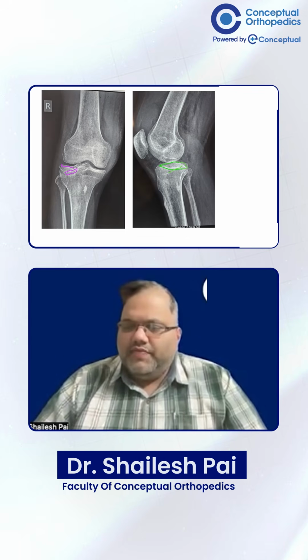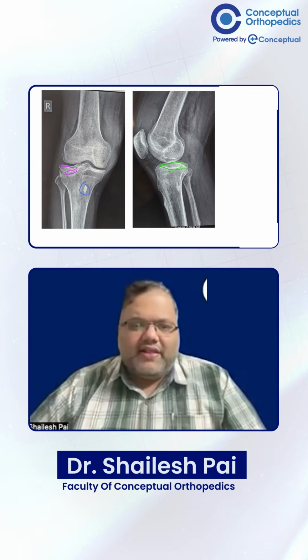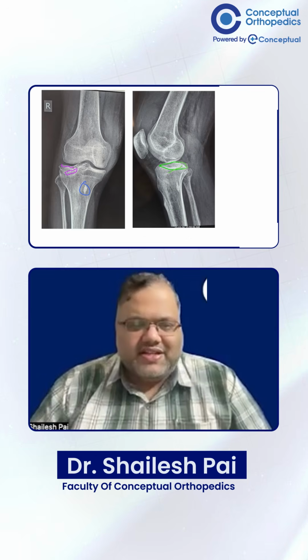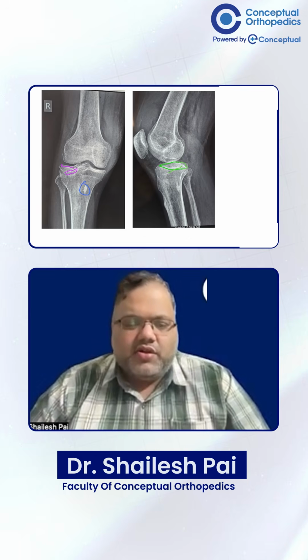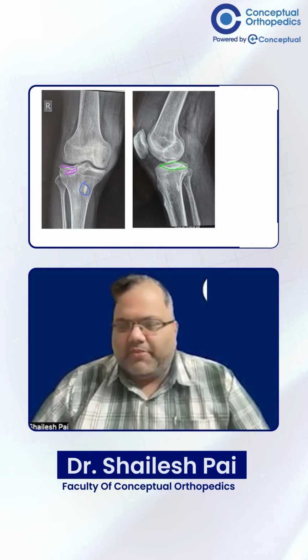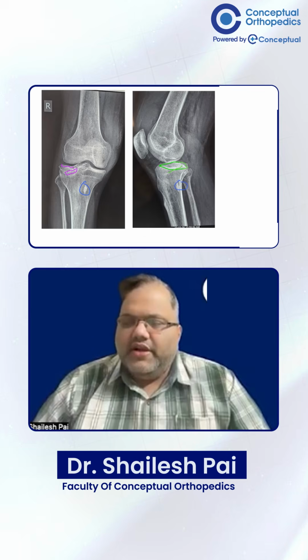Also keep a note on a bone island like thing which this patient already has. Now it's not pathological, but this patient already has that. Later on during the presentation, you will see that in CT and you may get confused that this is a depressed fragment, but it is not. It is a pre-existing thing that he has, of course, an incidental finding.